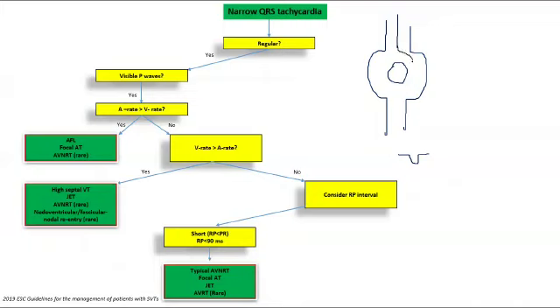It tries to conduct down the fast pathway, but the fast pathway has just previously conducted a sinus beat, right? So it hasn't completely recovered from its refractory period, because we said the fast pathway has a long refractory period. So when this premature atrial complex tries to conduct down the fast pathway, it blocks. And then instead, it only conducts down the slow pathway, which is why you get a bit of a pause or a long PR interval, and then it conducts down the ventricles to give you a QRS complex.